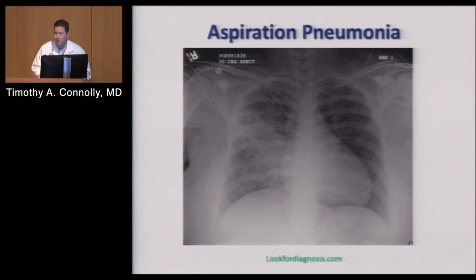It never goes in the right middle lobe unless you puke and you lay face down, because the takeoff for the right middle lobe is literally straight ahead. So it just doesn't do that when you're laying on your back. So when people have an infiltrate in the right middle lobe, don't assume it's aspiration pneumonia. That's extremely unlikely. It's more commonly going to be an atypical infection like MAC, the mycobacteria, Lady Windermere syndrome. So again, this is a classic aspiration pneumonia pattern.